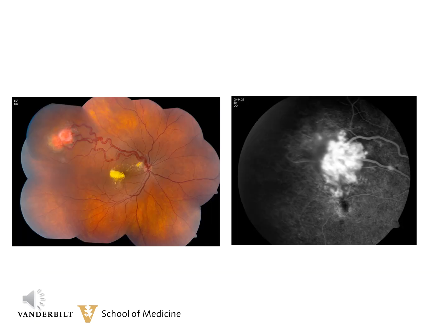This is a patient of Dr. Anthony Daniels here at the Vanderbilt Eye Institute. This patient has VHL with a hemangioblastoma in the far superior periphery of the right eye. The characteristic dilated feeding and draining vessels are clearly visible on the clinical photograph. Because these vessels do not have intact tight junctions, they will leak serum, and therefore this entire tumor complex will be hyperfluorescent.